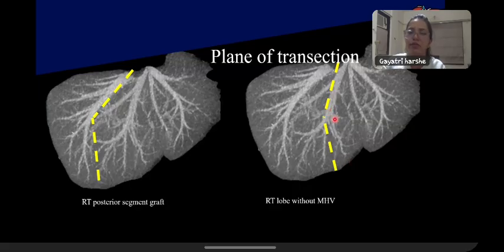So here is the segment 4 vein. This is segment 5 and another segment 5 vein, and the gallbladder fossa is important, because in cases of borderline FLR you need a correct margin, because even when we resect on the radiology, this can be slightly 10% plus or minus. So you need to identify the exact plane for that.